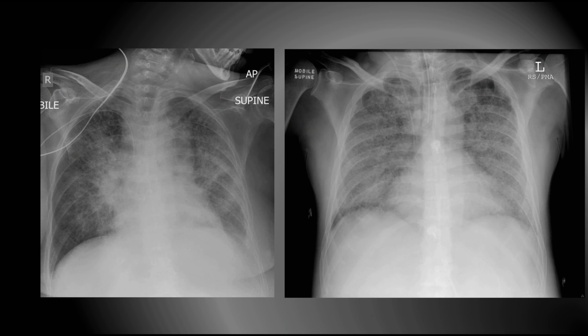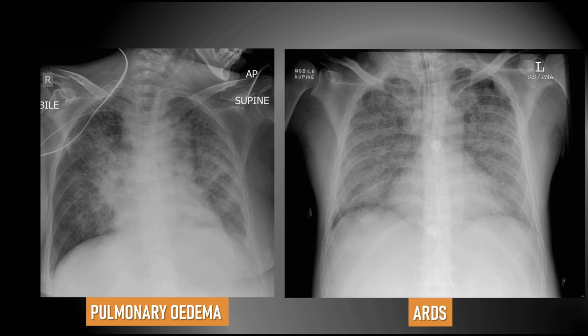How do I know that this is ARDS versus acute cardiogenic pulmonary edema? Remember, with cardiogenic pulmonary edema, you're looking at hydrostatic pressure problems. So there is venous hypertension and there's upper lobe venous diversion, hence the bat wings in the picture that I've already shown you on the left. There is peripheral sparing in that picture. In this case, on the right, the lung fields are extensively diseased and there's fluffy infiltrates throughout. So that's typical of ARDS.